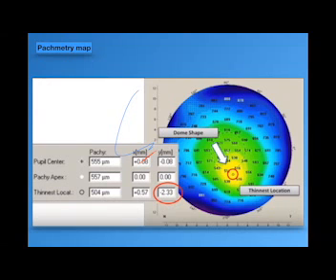If there is a tongue, a protruded tongue in the back of the cornea or on the anterior of the cornea, you will suspect that, because we may find points which are in the normal or accepted range, but actually they are all borderline. If you find that they are all borderline, go to the topography again.